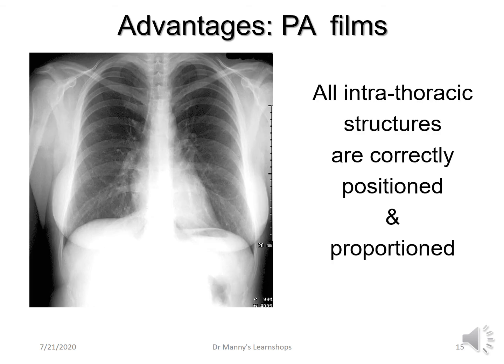The advantages of a PA film are that all the intrathoracic structures are typically correctly positioned and well proportioned on the chest X-ray film. Nothing looks too big, too white, too small, too black, or in the wrong place, typically.